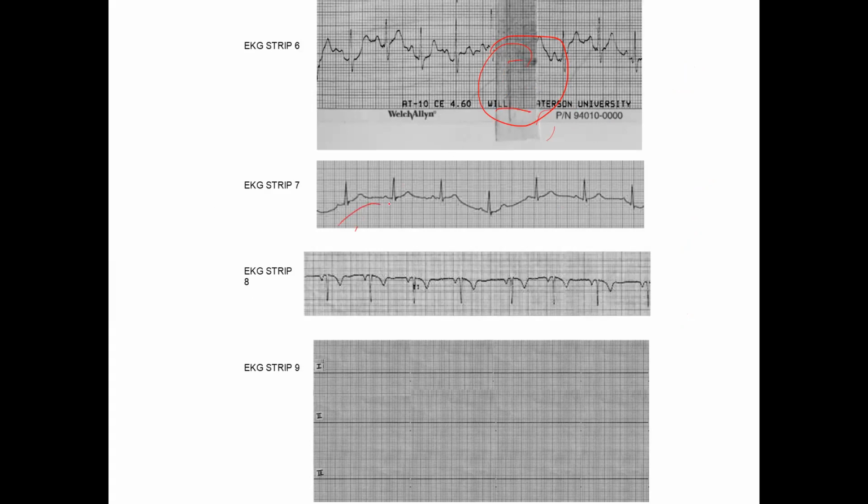This is breathing or laughing. You might just be moving the line around, which is very common. Nothing wrong with that EKG. This one obviously is you put the electrodes on the opposite poles. You put the right leg on the left, the left leg on the right arm, and you mixed them up, so it came out upside down.